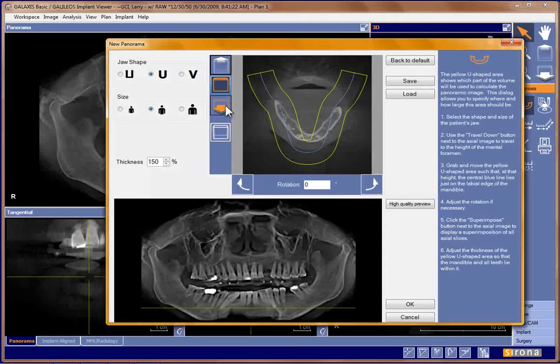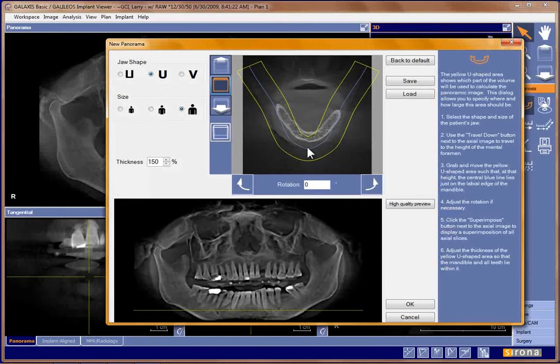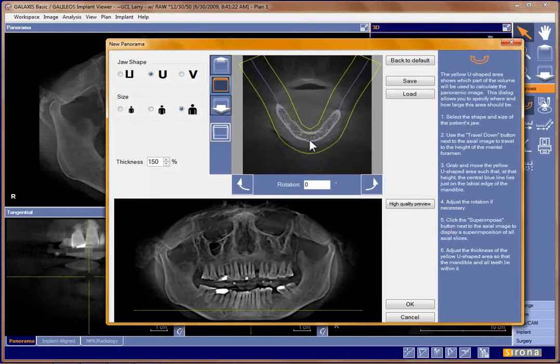When the person is tilted in this manner, sometimes it's a little difficult to find them both in the same plane. And so what you can do is kind of split the difference. So we'll go down, there's one notch, there's the other notch. Now that we see the notch here, we're going to go up just a little bit to start to see that one, and I'm going to split the difference here. Left click on the axial view allows you to take that full focal trough and put the blue line just on the outer edge of the bone.